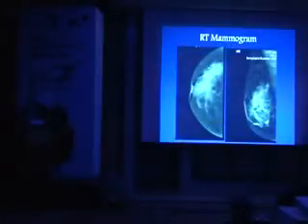So anything abnormal? Okay, let me make it easy for you. I'll repeat it again, and I'll help you. Okay, we are coming from down to up, inferior to superior. Now look, one lesion that showed up, second lesion that showed up. Everybody saw this? Did anybody not see these two enhancing lesions? Okay.